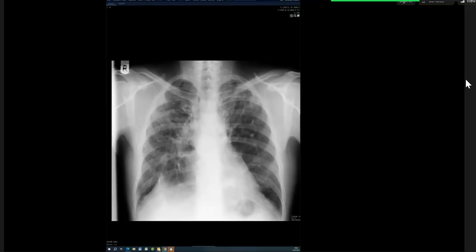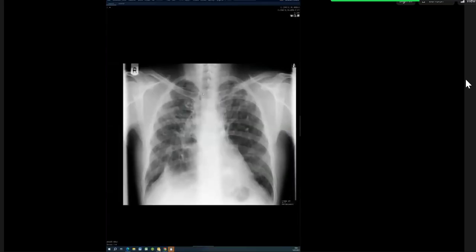So this is a cause of mid and upper zone fibrosis. I'm looking for causes like sarcoidosis. I'm looking for any hilar lymph nodes. Then tuberculosis. I'm looking for any apical opacities. Then another cause is radiation, but there is no specific pattern of involvement. Another cause could be ankylosing spondylitis, so I'm looking for any calcification of the interspinous ligaments, which I would like to window for appropriate seeing. And another cause could be drugs, so I will inquire with the patient for any history of drug exposure. Okay, well done. That was so much better than the first time.